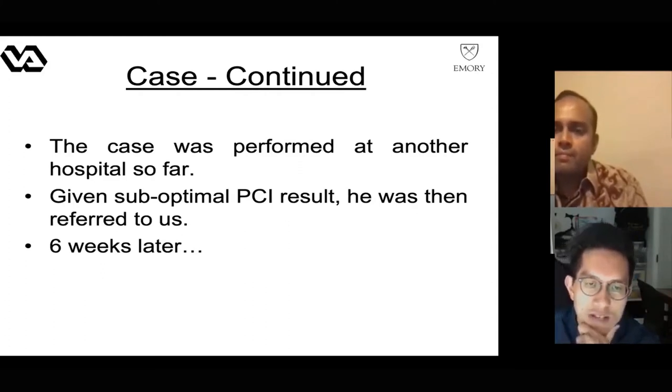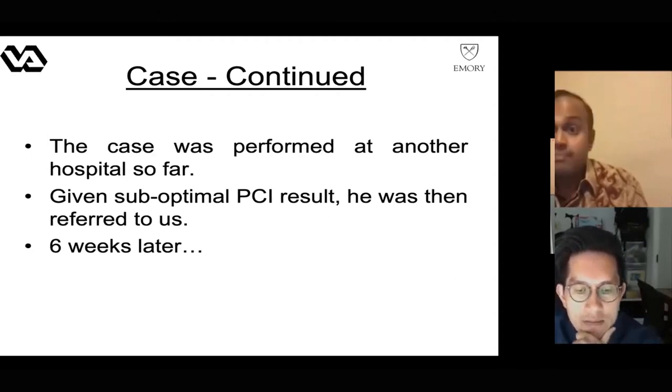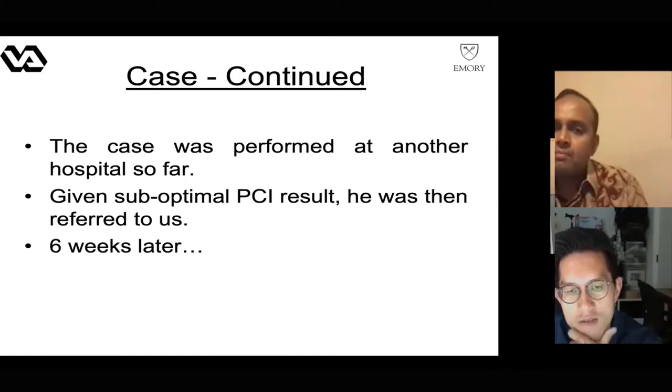And now, of course, the stent is in and makes your life more tough for you. To me, the question is how soon we intervene. I think because the stent was just put in and it is a drug-eluting stent with all the drugs there, I might closely monitor the patient and I'll go in only when the patient has symptoms again. That's my approach. Of course, I can see that the stent is under-expanded, but yet it is not really bad.